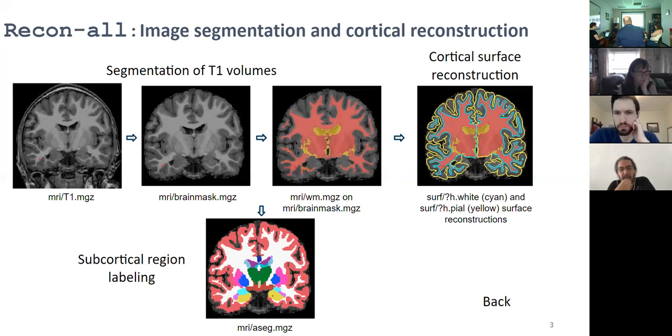Okay, we can look in more detail at what the recommended pipeline is for this type of lesion data analysis, and I will be curious to learn a little bit more about that as well. I've just Googled it because I was curious, and FreeSurfer has a page on what to do. So it looks like people are using FreeSurfer even with lesion data.